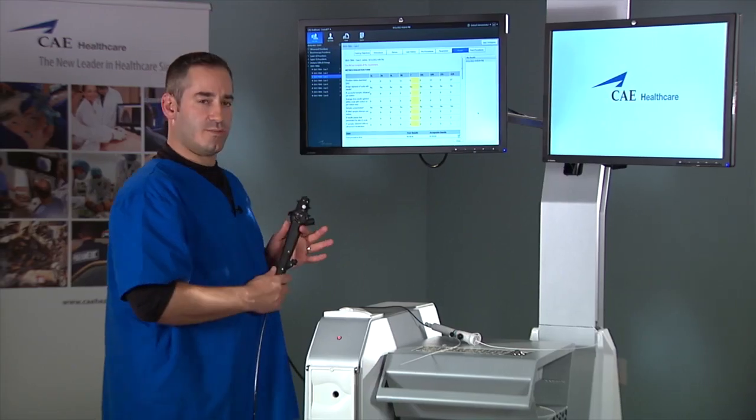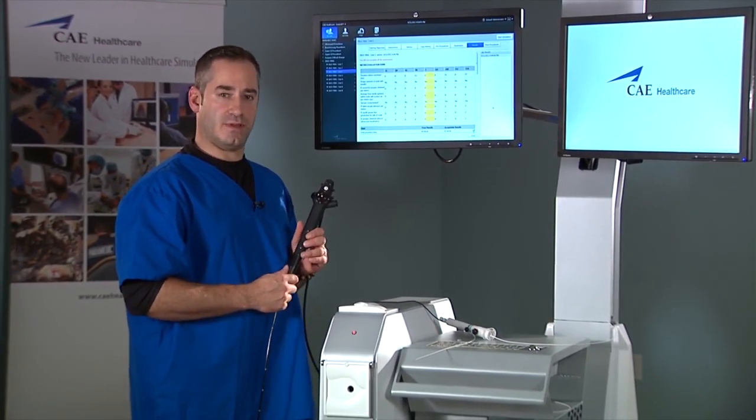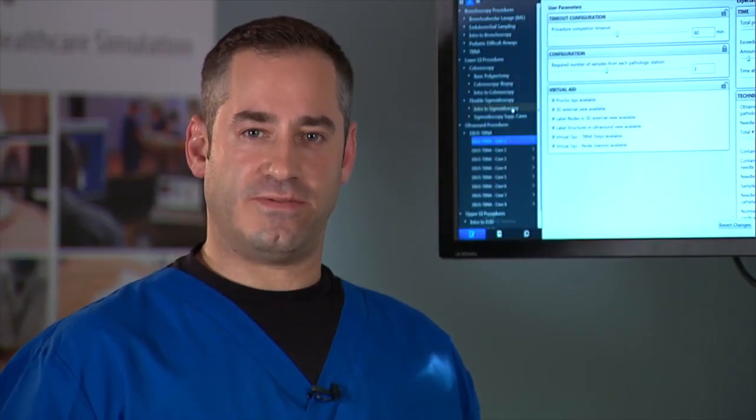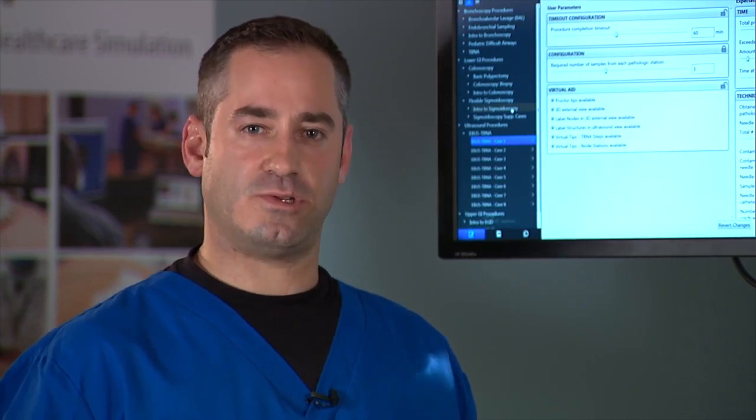And that concludes the presentation of a bronchoscopy procedure on the EndoVR simulator. Having now reviewed the end user interface and how to start a given case, let's take a minute to look at the administrative features.